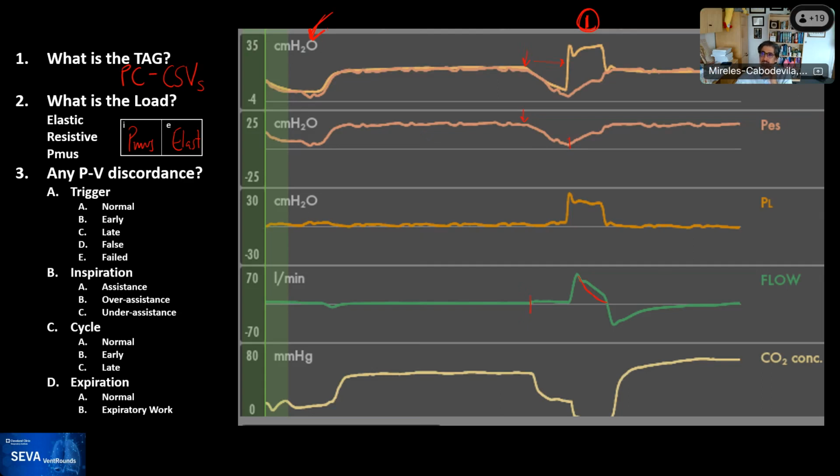Okay, I'm starting to see some answers come in. Yeah, that's a great observation, Samin. So in general terms, if this was a flow trigger, the pressure would not have dropped.